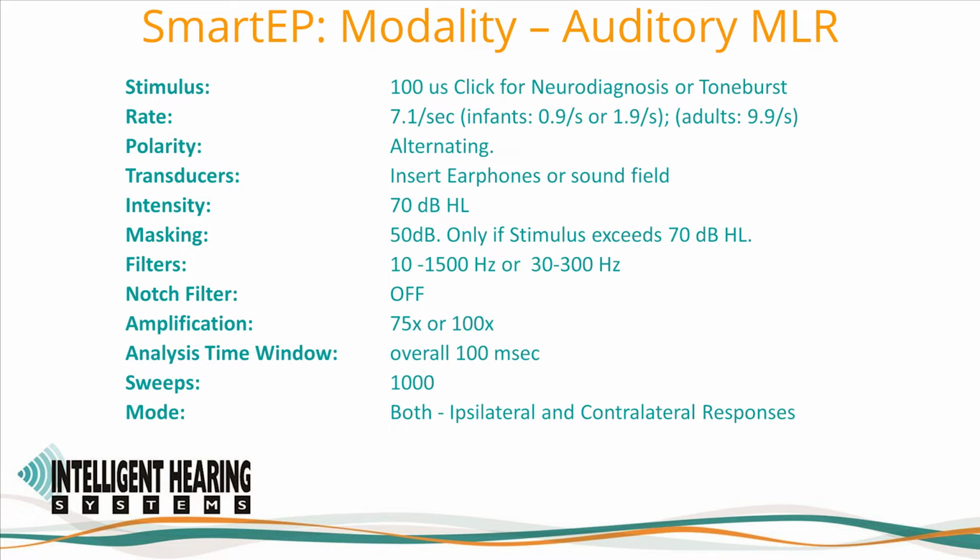The overall analysis time window is usually set to 100 milliseconds. Sweep count is about 1,000. For two-channel systems, you can set the mode to both and acquire both ipsilateral and contralateral responses. Otherwise, ipsilateral responses may suffice.